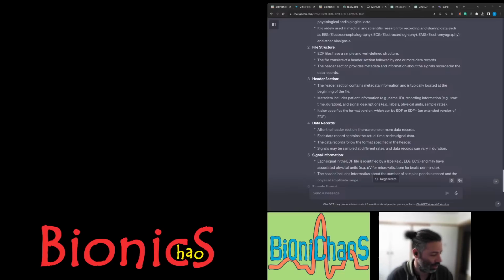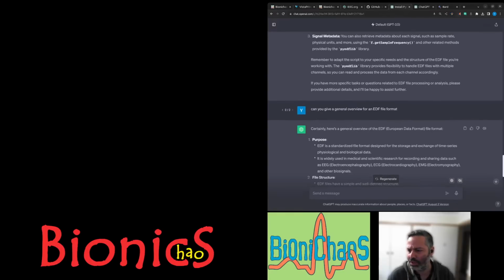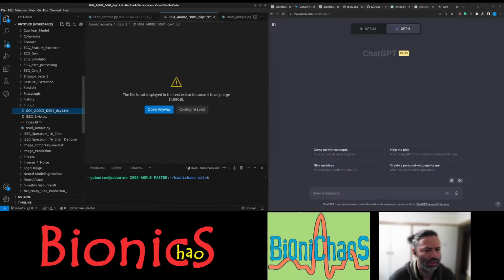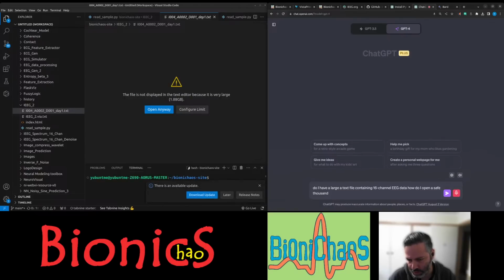Crashing, I just need to open parts of it. Let's use... this was GPT-3.5. Use GPT-4 here. Yeah, this will be an example. So I have a large text file containing 16 channel EEG data. How do I open, say, 1,000 samples out of this file using Python?